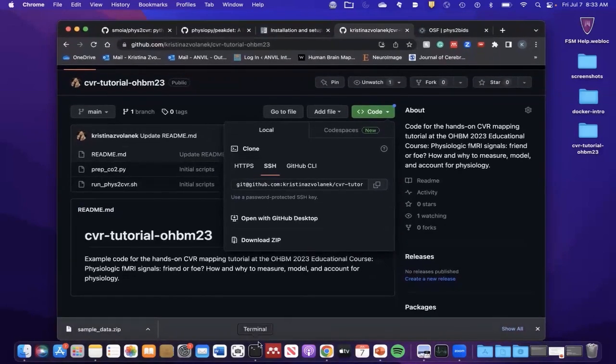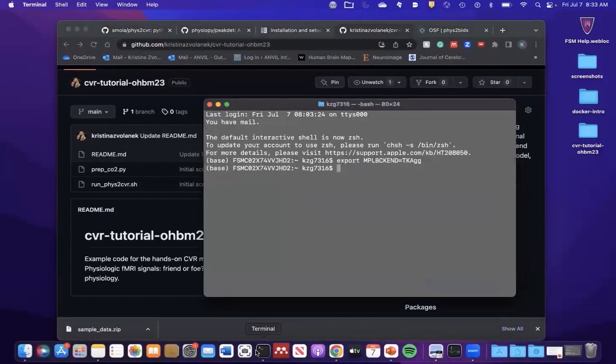I am going to now save the sample data within this folder. So if I just navigate to my documents, this is the code that I have just copied in there. And then I'm going to open a new window here to access the downloads of my sample data.